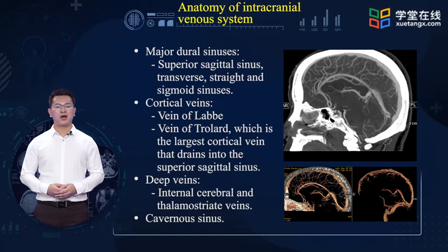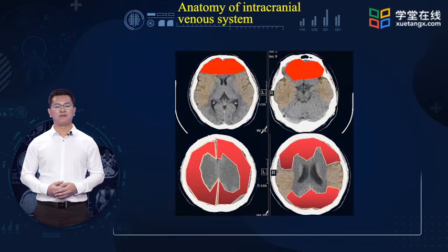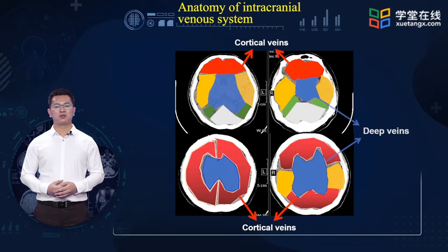Venous infarcts are typically seen in parasagittal structures following sagittal sinus thrombosis, temporal parietal regions in transverse sigmoid sinus thrombosis, or deep structures. This is an illustration of the territories of the venous drainage. There is great variation in these territories, and the illustration should be regarded as a rough guide. Students should keep in mind that infarcts with or without hemorrhage do not correspond to the typical artery territory.